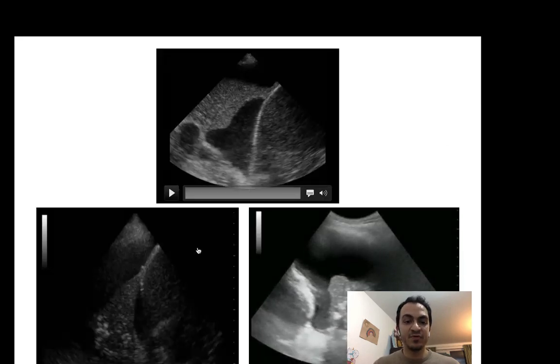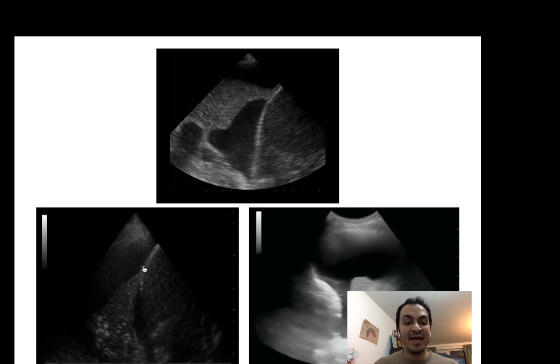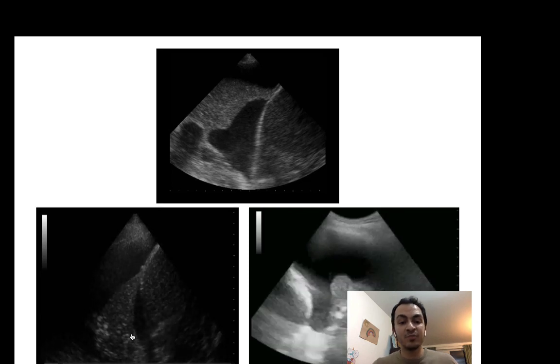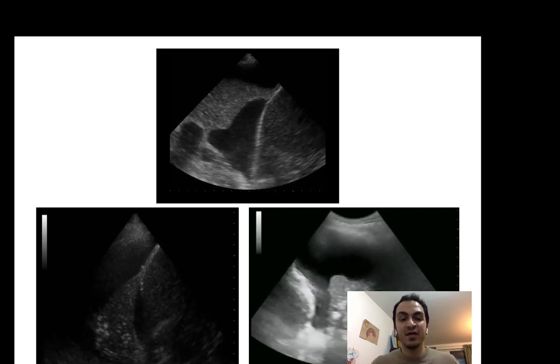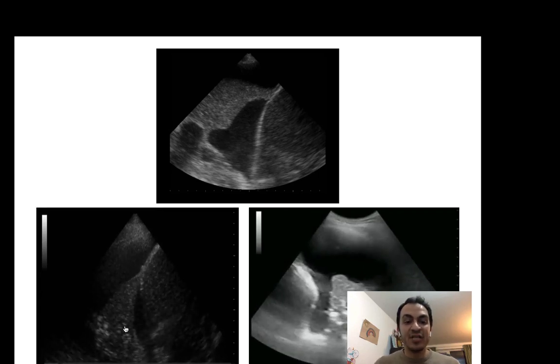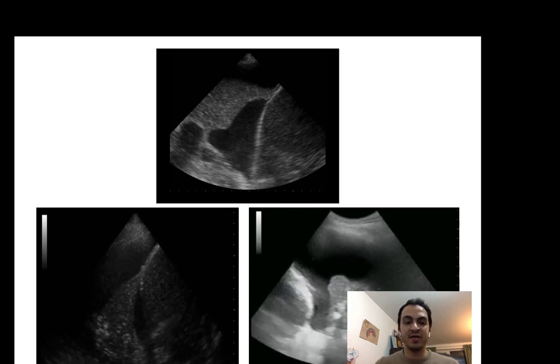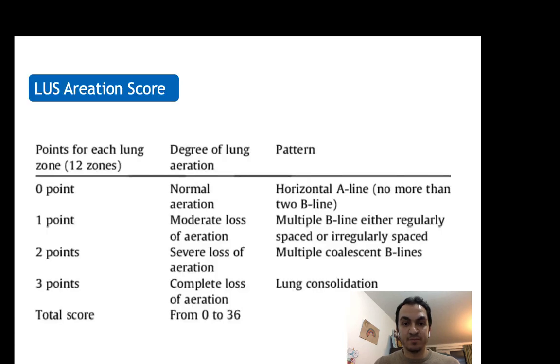And it's typical to see this in patients with large amount of pleural effusion, and it can cause what they describe as the jellyfish sign, where they have large pleural effusion compressing the lower lobe of the lung, causing what is looking like a jellyfish, an area of the lung moving or floating inside the large bag of fluid.